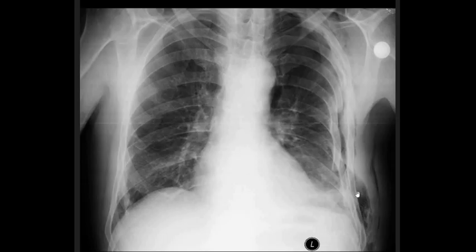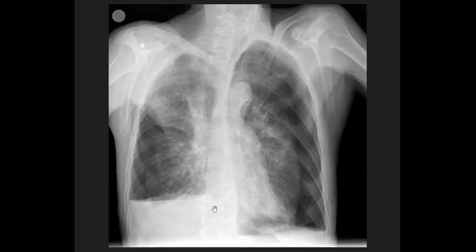It could be from the damage of the lung or outside damage that has appeared in this trauma. So sometimes pneumothorax can be very subtle, and you need to be very careful in order not to miss these subtle pneumothoraxes. Then we have also this picture.